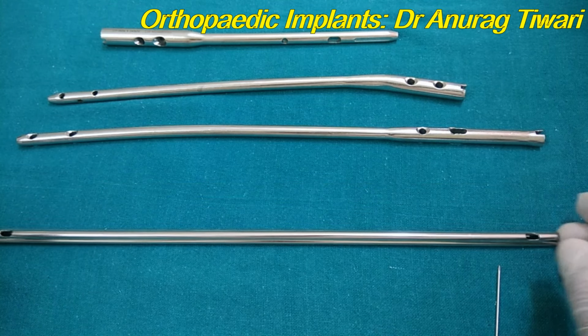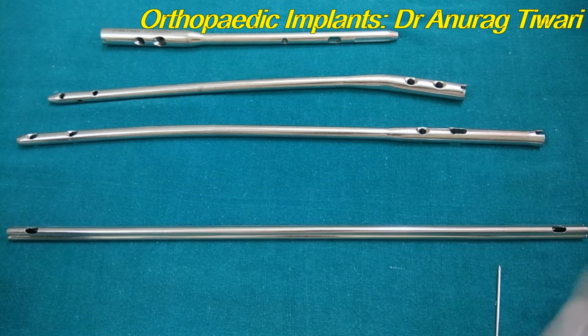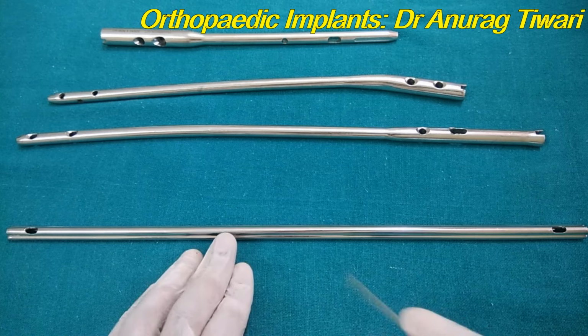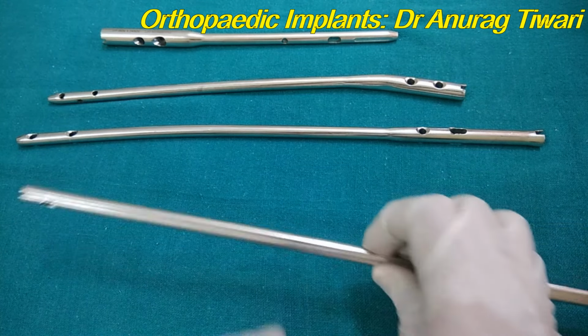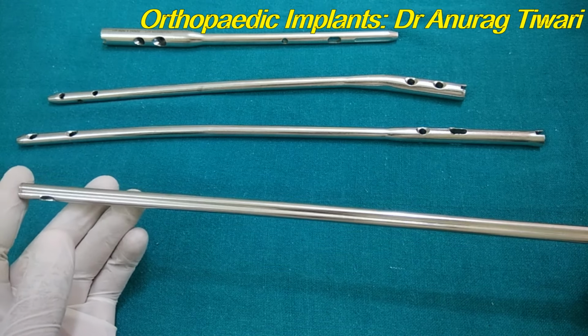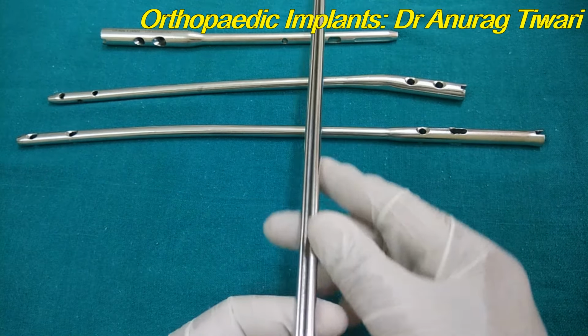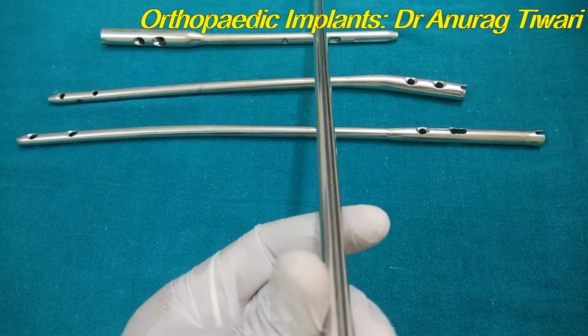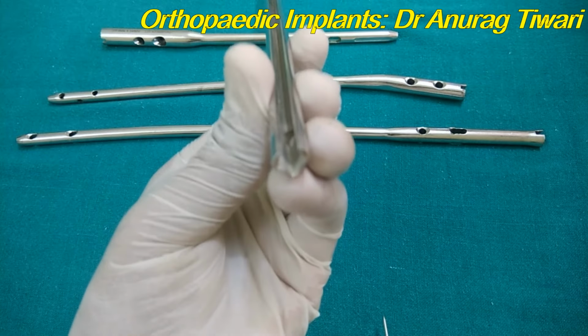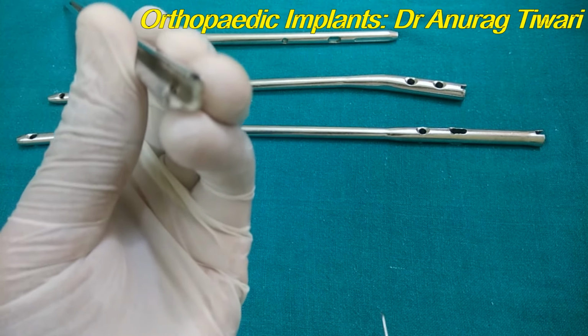Now this nail, when the nail was made the first time, it was this. This is known as the K nail or Kuntscher nail. It was invented around 1945 during World War II by Kuntscher in Germany. The basic idea of this nail is to give stability to the fractured femur, and it is an incomplete type of nail, or we can say a hollow nail with a slot. Now this is the slot you can see.